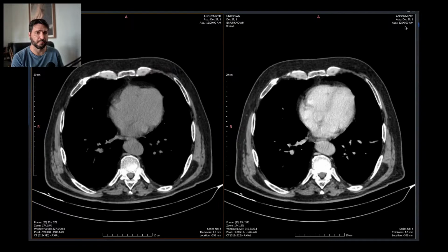These are sectional images. This is the heart. These are the bases of the lungs. We have to understand that this is the front of the patient, the ventral portion of the body. This is anterior, this is posterior, supine position. This is the scanning table. This is left and right. It's as if we were sitting at the soles of the patient's feet, looking towards him or her.